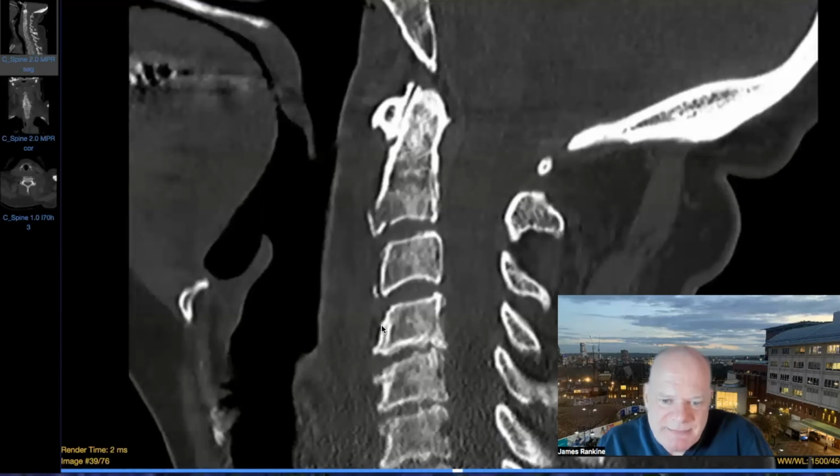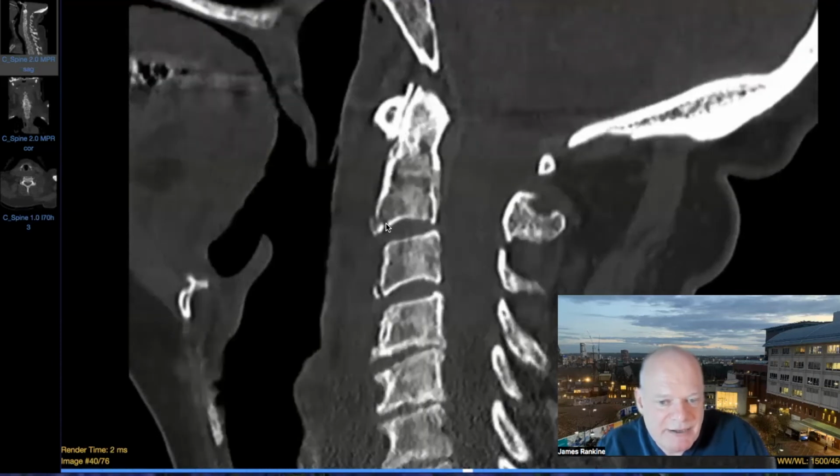And of course, you have to remember that the anterior longitudinal ligament is coming up here and attaching along here, and it will often just take a tiny flake off, which may well appear to be longitudinally orientated. So it doesn't necessarily have to be a horizontally orientated one, which is more when the fibers of the annulus of the disc pull the end plate off. So this is quite a characteristic appearance, really, of a hyperextension where the anterior longitudinal ligament has pulled the flake off. Now, how do we explain this teardrop at the level above?